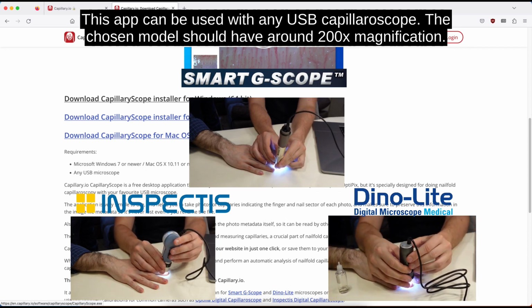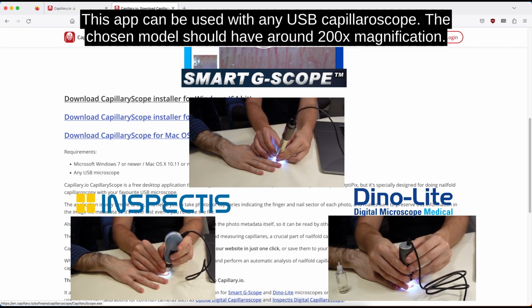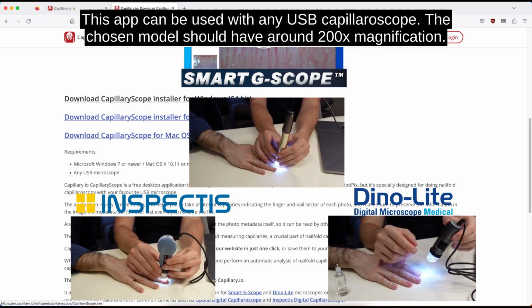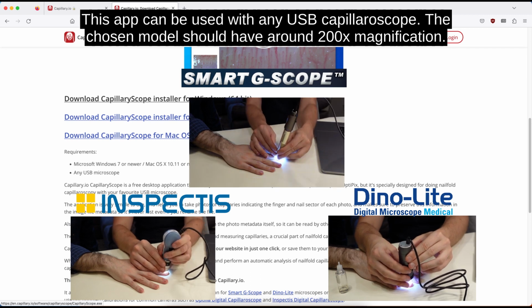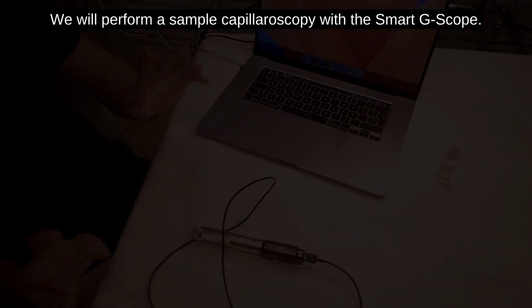Even if your capillaroscope is not automatically calibrated, Capillary also has the option of manually calibrating your device. That's a little more advanced, and we are not going to cover it in this video tutorial, but later we can comment on it in the questions. Calibration is important, so later the distance measurements are precise and capillaries can be measured correctly.